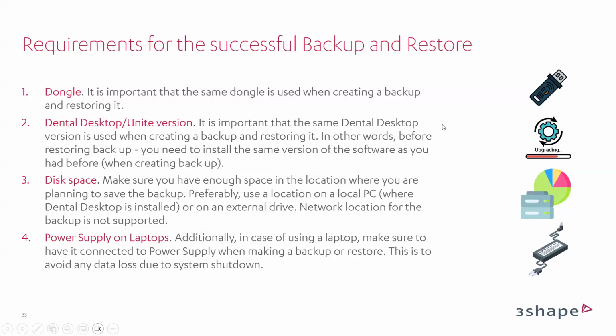Also, there are requirements for a successful backup and restore. The first and important one is the dongle. It's important that the same dongle is used when creating a backup and restoring. Also, the Dental Desktop or Unite version: it's important to use the same versions when you're creating the backup file and restoring it. As mentioned here, before you restore the backup, you need to install the same software version that you had before on the old system.